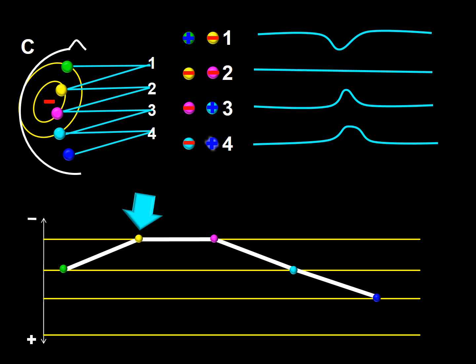It is very important for you to remember that you always need to compare the anterior electrode with the posterior one while building a voltage graph. This is so when you are building a voltage graph for a bipolar montage. In this case, the bipolar montage is longitudinal. If you were analyzing a transverse montage, then you compare the electrode on the left to the electrode on the right.